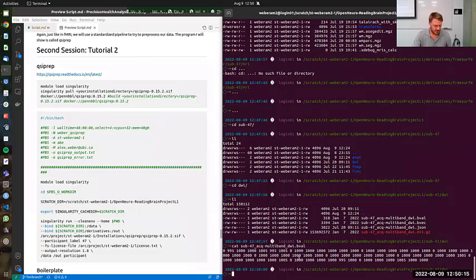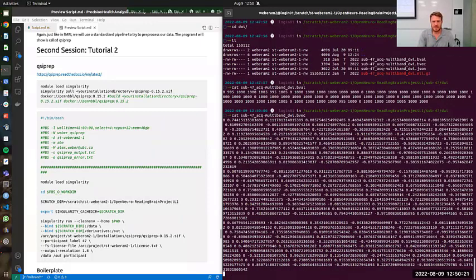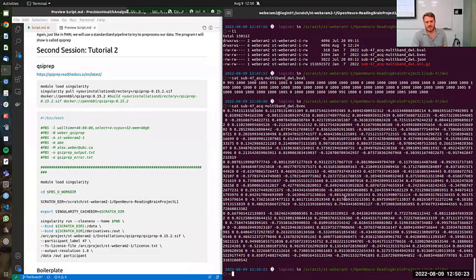I haven't personally done that. And the bvec should be the directions, so it's going to look crazy. So these are the directions. I'm going to visualize it in a second, so we'll understand. Anyways, we have our JSON, our bval, bvec, and our NIfTI. This is ready for QSIPrep to use.